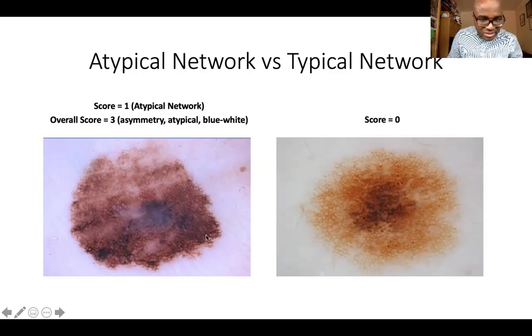Diagnosis, this is a suspected melanoma. You're going to refer it.